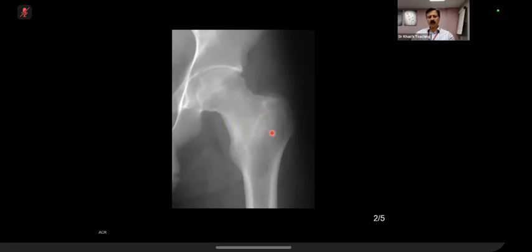So within that, there's a lucent lesion at the inferior aspect with some. You're talking about this aspect? Yes. Okay, look somewhere here, please. The quality of the film is poor, so don't worry, because it's projected very faintly.